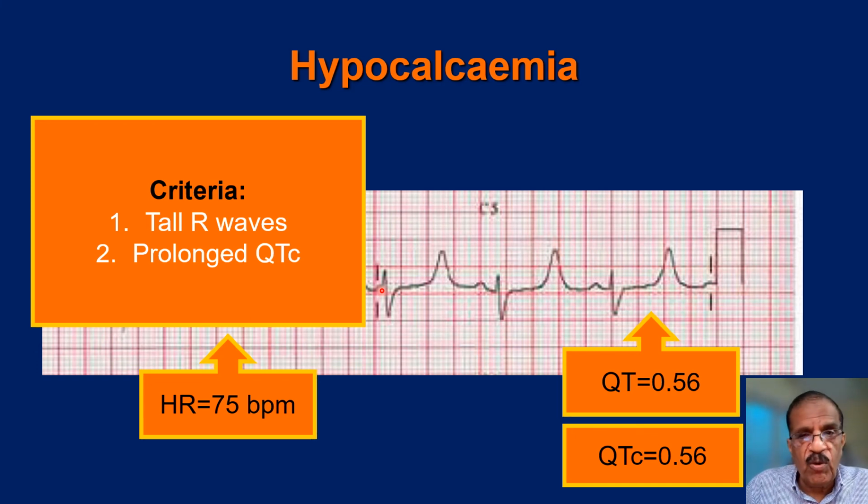Only a very expert would be able to figure it out. Most people will not be able to exactly pinpoint or interpret the ECG in that setting. So that is why I always say the ultimate test for electrolyte abnormalities is blood test, actual electrolyte measurement. But ECG provides a very, very fast and reasonably accurate first indication of electrolyte abnormality, and you may be able to save time, because these abnormalities, particularly hyperkalaemia, may be very serious and can kill in minutes. So I think that gives you an opportunity to save these patients.